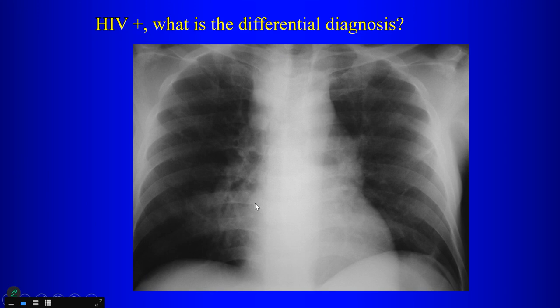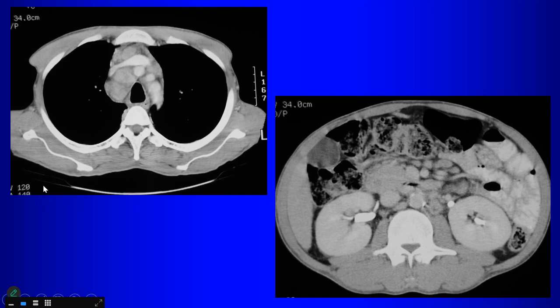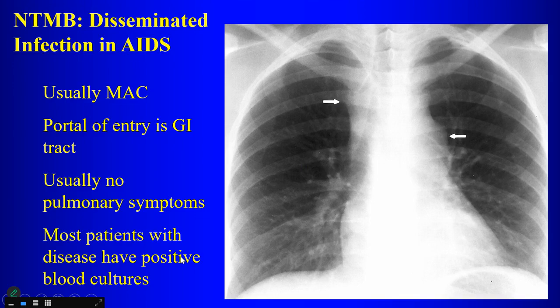Lymphadenopathy, right. So you have right paratracheal lymphadenopathy here, some opacity over the right hilum, lymphadenopathy. It can also be in the abdomen. We also see some enlarged lymph nodes here within the abdomen, so not only within the chest. But if they have a low CD4 count, patients who are HIV positive can develop systemic infection with MAI, which predominantly might present as lymphadenopathy, not much in the way of lung pathology, no lung damage, just lymphadenopathy.